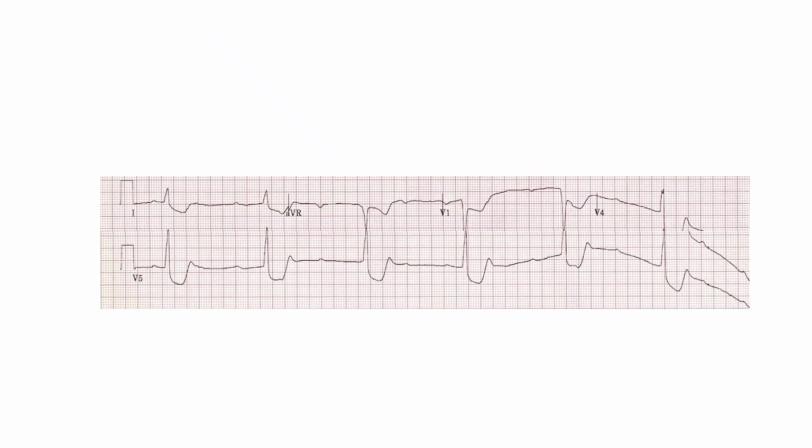Now to the AV relationship. Is there a P wave before every QRS? Scanning along, I see there's not one before every QRS at a fixed interval, therefore not sinus. Then I see we've got consecutive P waves. We've thus identified at least a second-degree heart block.